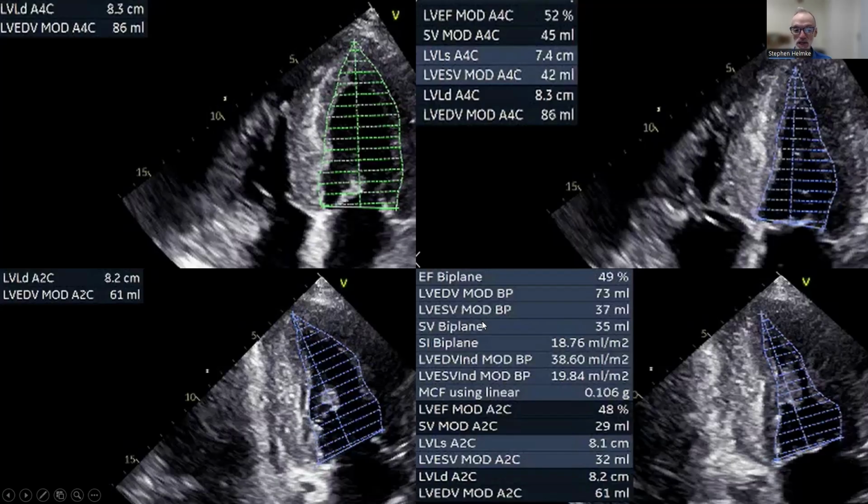Looking at the way that I measure EF gives you a little more insight. See this grid pattern here? This is me measuring the left ventricle in what we call the four-chamber, that four-room duplex house I showed. This is in diastole when it's full, and this is the same measurement in systole after it's squeezed. So how much gets in and how much gets out? The percentage of those two is ejection fraction. Well, look at this heart here. It's 52%. In spite of how thick-walled it is, it's beating, it's squeezing fine. 52%, 55 is completely dead normal.